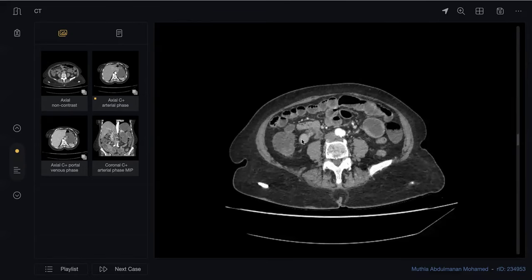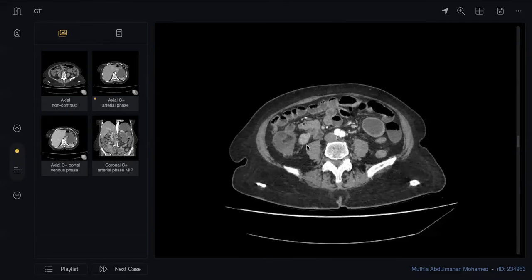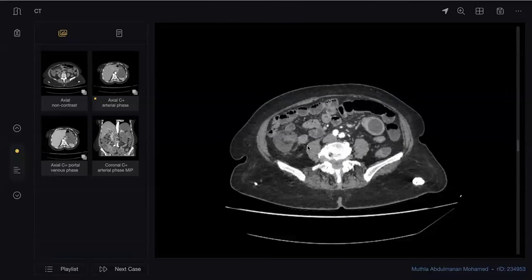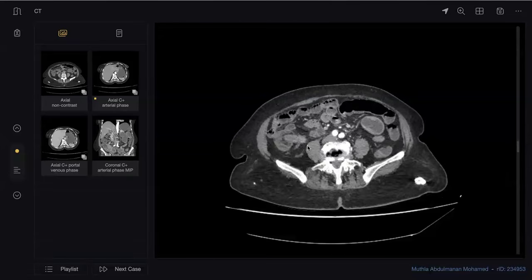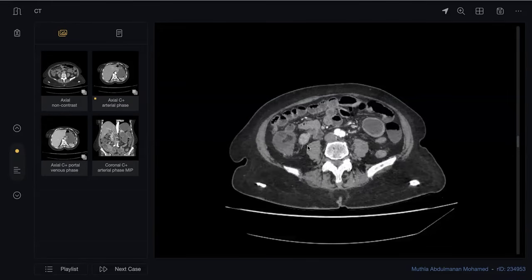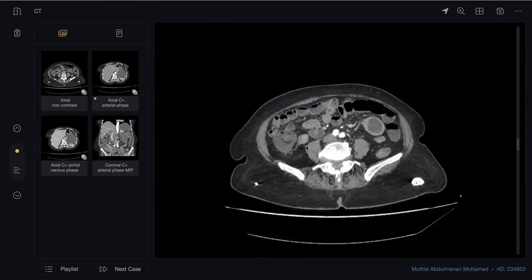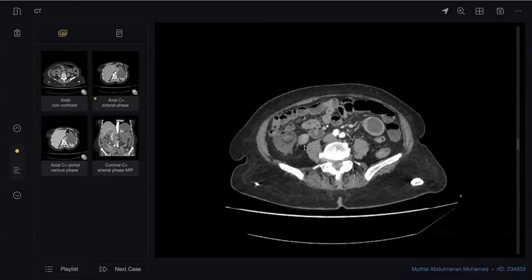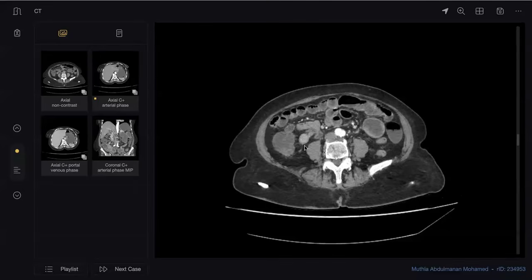This lesion is hypervascular. Where could it be arising from? From the terminal ileum, I think, or the ileal outlet. I need to appreciate. Yeah, it's within the terminal ileum, and it's surrounded by stranding of the mesentery. So this is, I think, terminal ileum carcinoid.